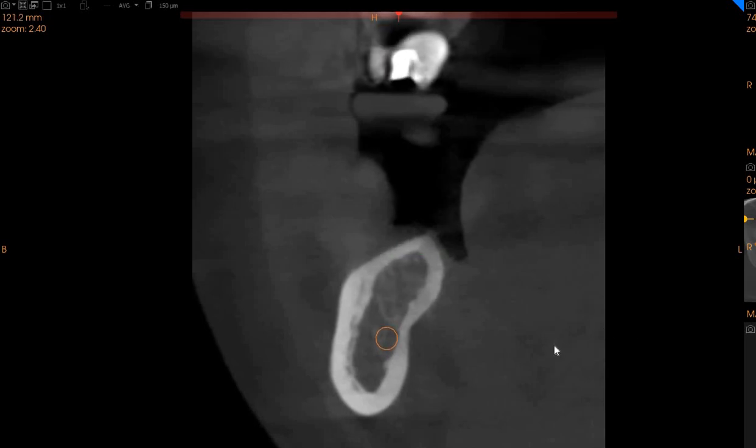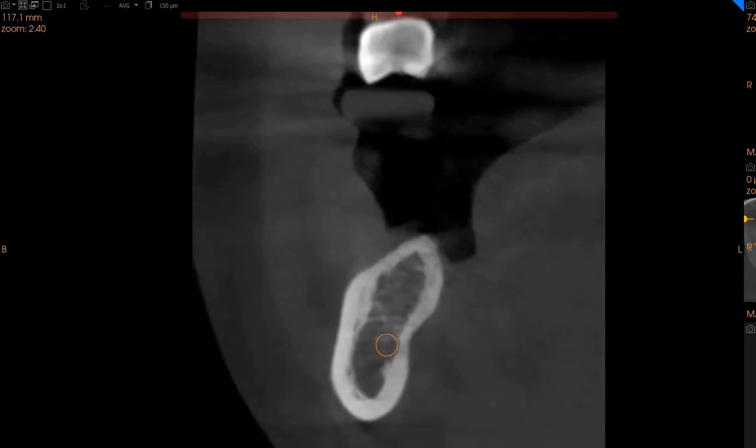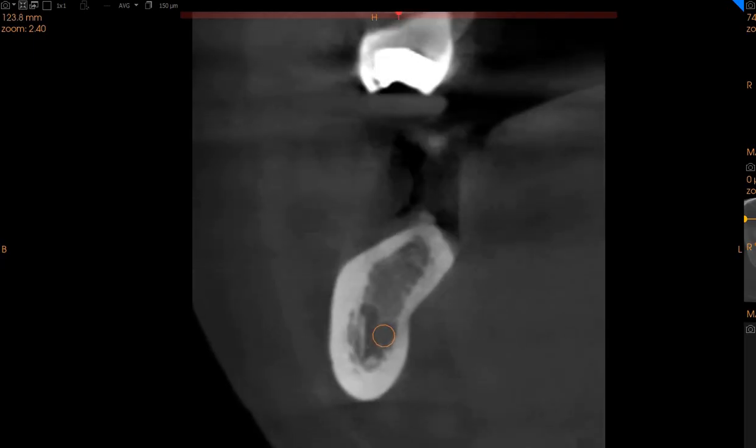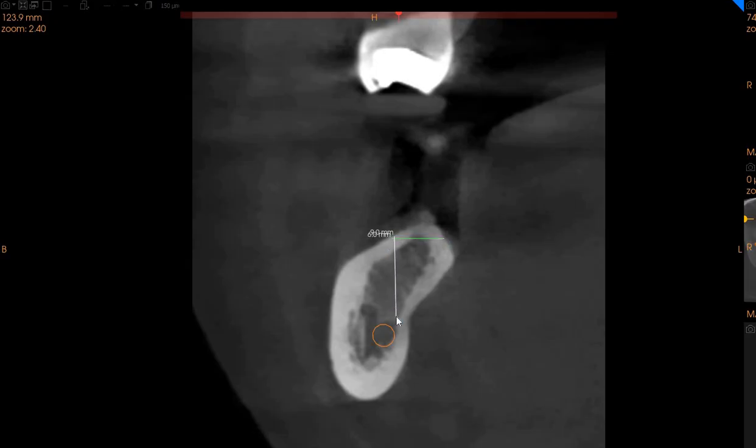So a small and slightly thicker implant can be placed, or we can also suggest placing two implants, one close to the 5, where we have approximately 6 millimeters of ridge width with 10 millimeters of height. So a narrow implant here, a 3.5 or 3.8, and then we can place one right here. It's going to be a slightly short and fatter one, a 4.5 and a shorter implant. So that can also be done.